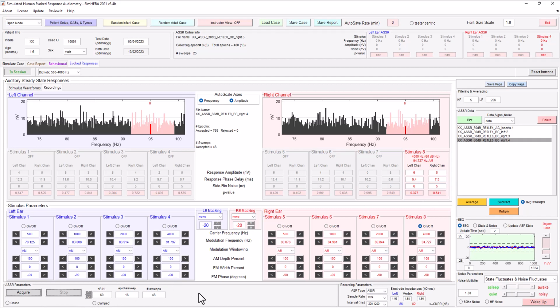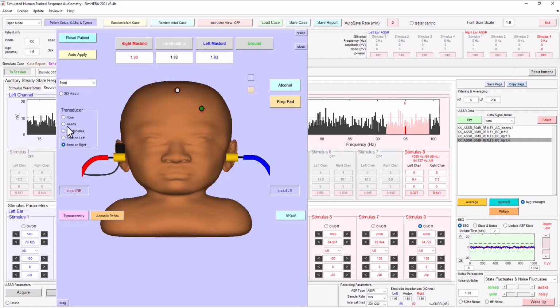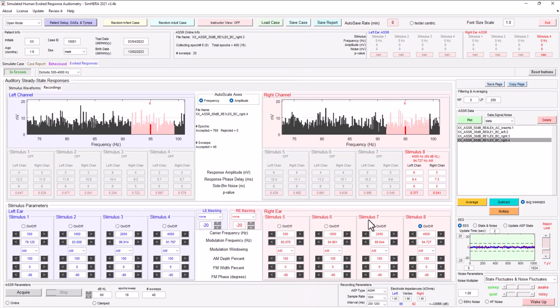So then we're going to be now going back to air conduction, and inserts are in, and 4,000 hertz. Now we're going to be going up to 90 dB because we're now doing a threshold search.